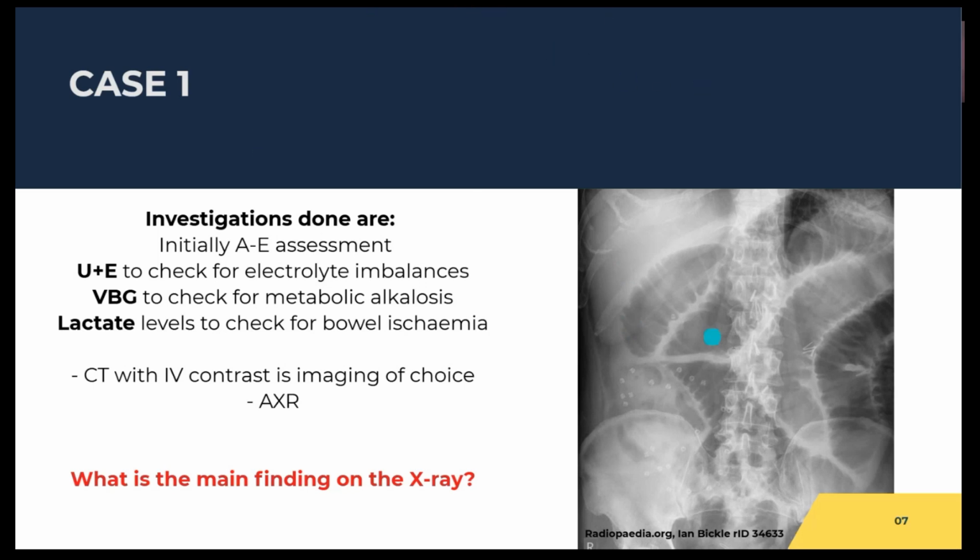So in this image here, what is the main finding that you can see on the X-ray? Okay, so that could be a potential small bowel obstruction, yeah.